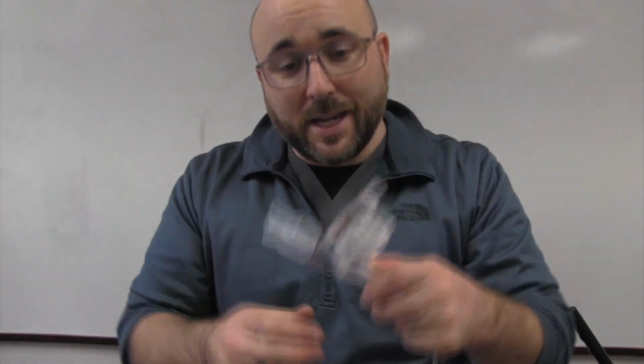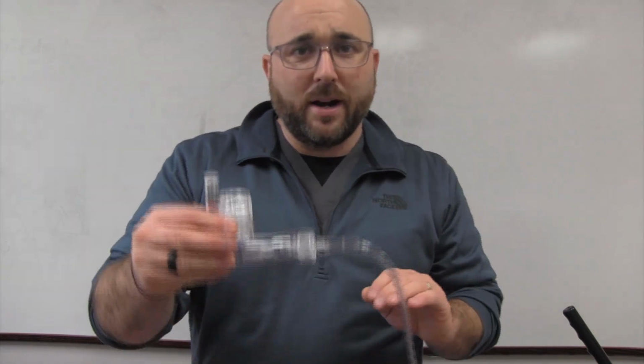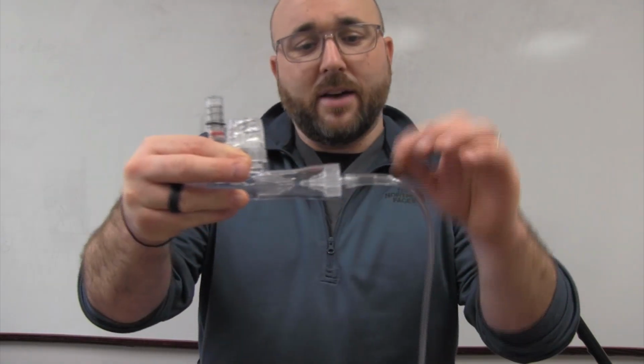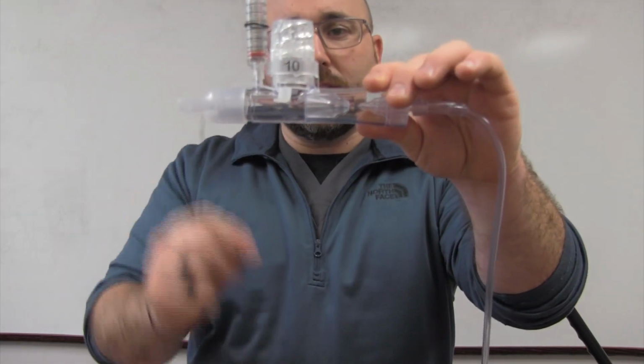So let me hook this thing up. I'm going to hook it up to 8 liters. I'm running off a tank. You usually run it off the wall, but run it on air. You can run it on oxygen. It's kind of loud, as you can hear. Make it a little quieter now by occluding it. But what's now 8 liters is going from here through here, coming out at the mouthpiece on this side.